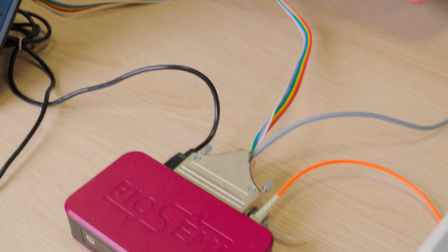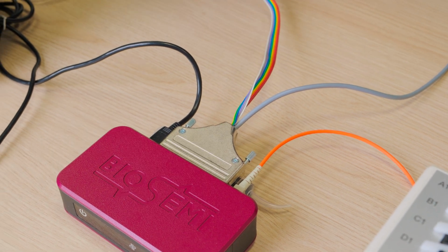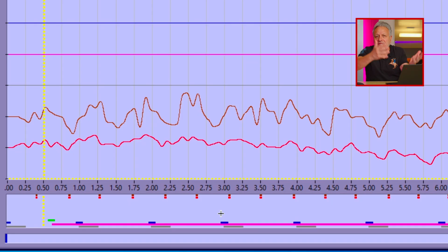What you can do though is, remember the setup on the table, you saw that I had a split trigger cable. We had 8 bits that came in from Presentation, like it did here. And we have 3 bits or 2 bits that go over to the light NIRS for the start event and for the second triggers. That's all I want to have in my light NIRS file, because when I present 8 additional bits from Presentation, I can use a splitter cable, and because the 8 bits are in the EEG file, they would appear obviously also on the merged NIRS file as well.